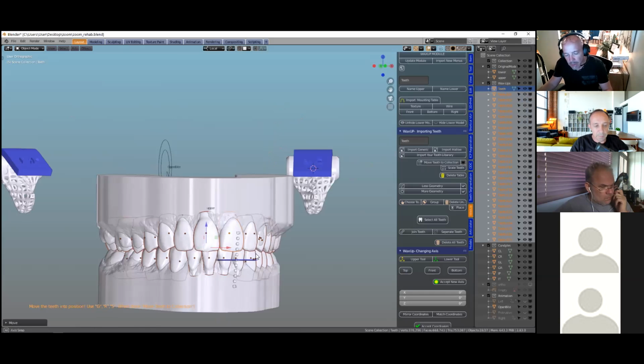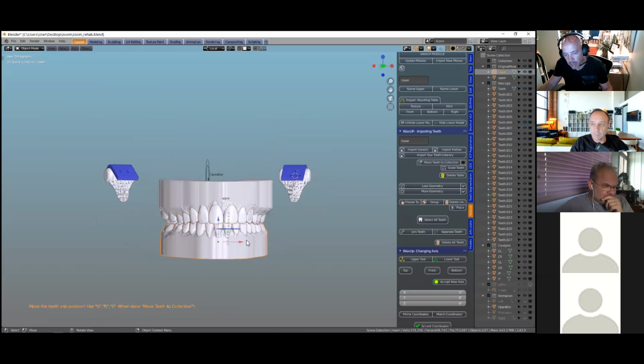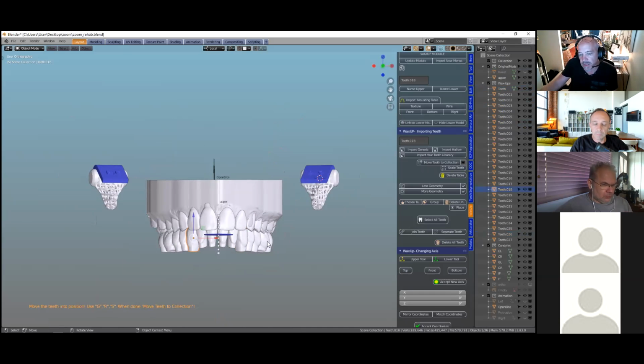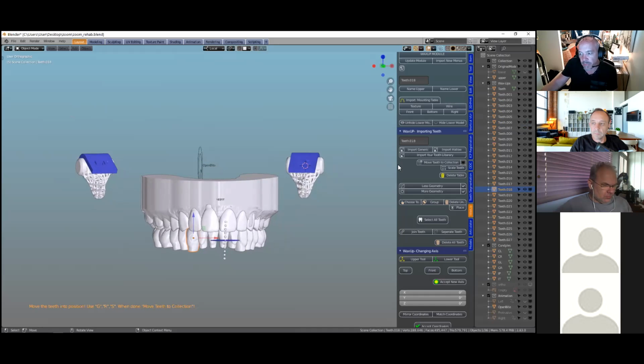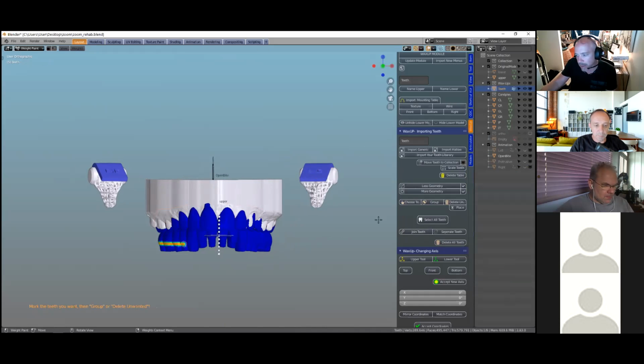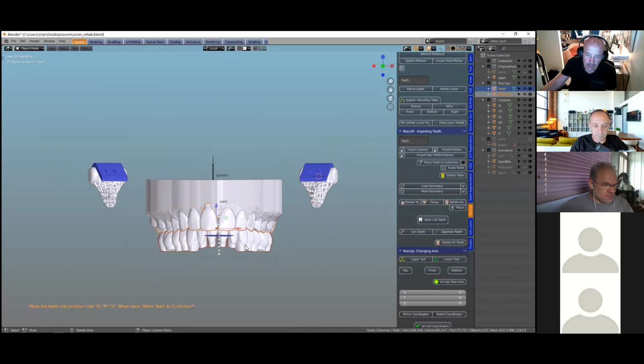And this is what I was saying earlier, because these are all individual now, and this is really a pain because we may want to separate them in groups. Well, it's easily done. I'm going to select them, join, and then we can redo this like that. And then we can group them, and that puts the top and the bottom together.